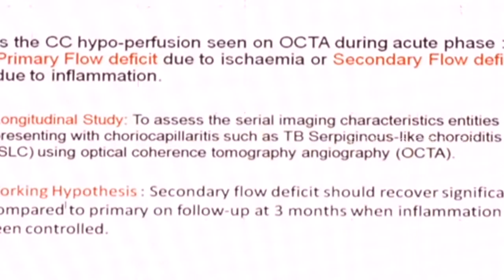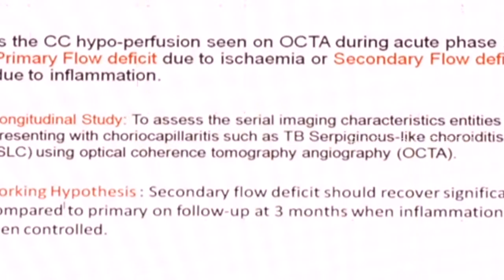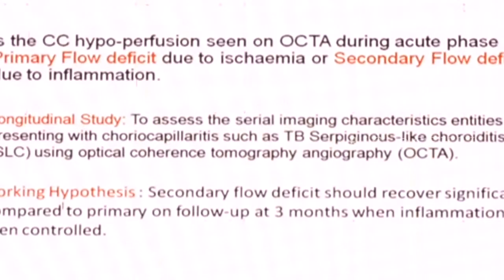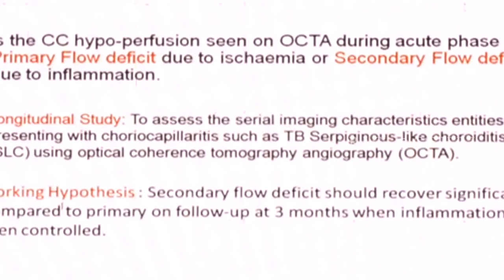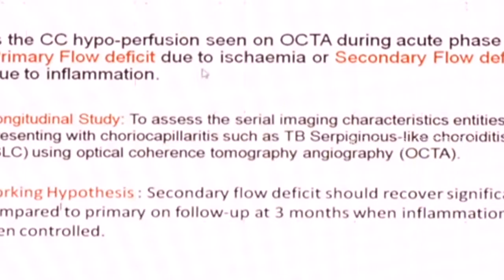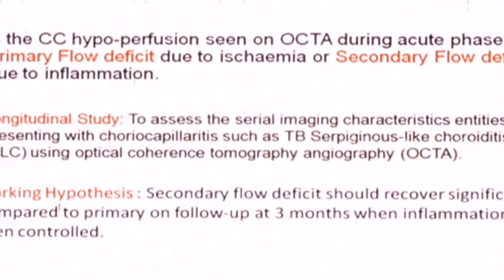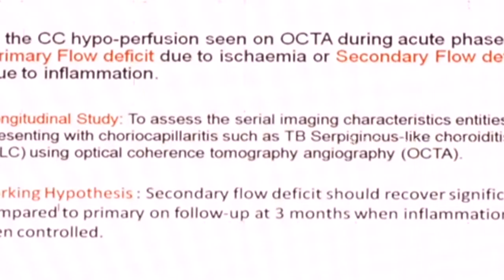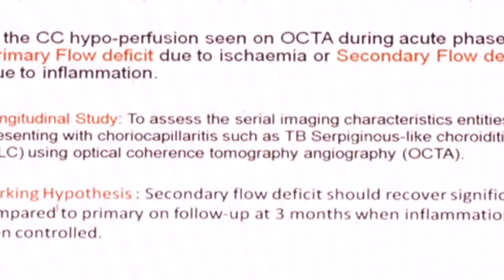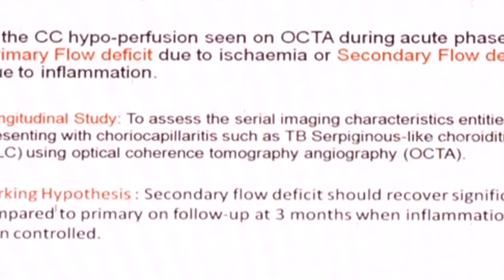So this we published in 2016 in Retina. The question which we still had in mind is the choriocapillary hypoperfusion that we were seeing on OCT angiography during the acute phase: was it a primary flow deficit because there is ischemia of choriocapillaries, or is it a secondary flow deficit due to inflammation, tuberculosis in this case? Because we have this eternal fight whether to treat TB SLC with steroids or no steroids. It only makes sense to give steroids if we can show the reversibility of these dark spots.